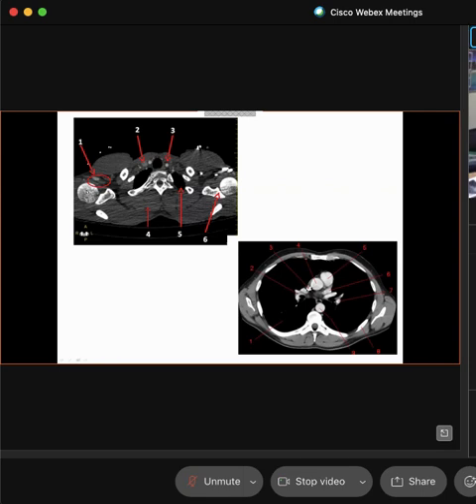So we have round. It's either going to be the thorax or the abdomen. It's not going to be anything else. Make sense? Yes? Good. So immediately lateral, you're going to see space. Immediately anterior, you're going to see space. So looking at this, what do you think this space or this anatomy could be that would give it a dark appearance, Amy?